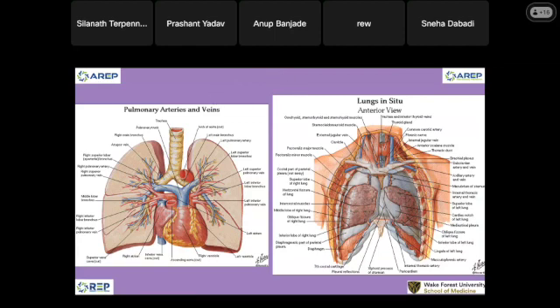So this is our scapula in the thorax here. This is our trachea. You see the trachea has cartilage, and the posterior of the trachea has no cartilage. It's just membrane. And this is the liver. So one ring to the next ring of the trachea, and this is the breast soft tissue of the patient here, all the way down. And when you are about to bifurcate, let's look into the right and left main bronchus. We call this area the carina. This is the trachea, carina, and then the right main and left main bronchus.